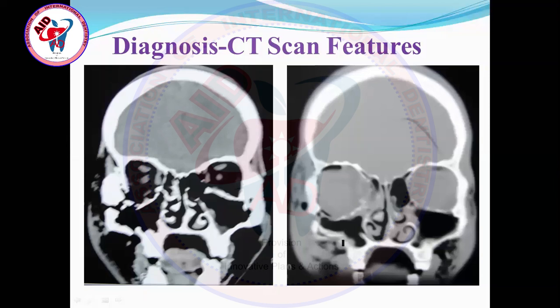And here, in this picture, the left side is the bone window and on the right side is the soft tissue window. And there is damage to the zygomatic region also. If you compare the sinuses on the left side and on the right side, this left-sided sinus is properly formed, normal, and in normal contour: zygomatic buttress region, zygomatic bone, orbital margin, you can say the floor of orbit or roof of the sinus, and lateral orbital wall.